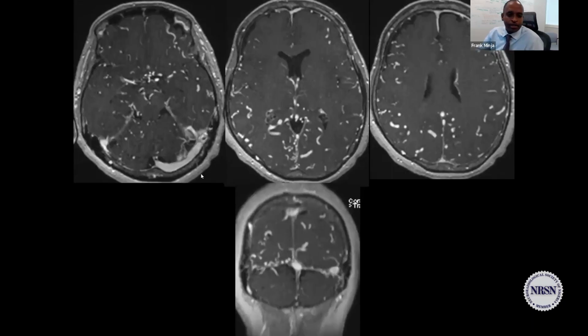I love this case because the first question is, are you looking at arteries or veins? So let's play a game here. Who votes for arteries? Who votes for veins? We've got a few more minutes here. All right, guys, let's play along. We're almost to the end. What are you looking at? Arteries, veins, arteries, veins. All right, 50-50, guys. We can play this, we can play bet. Let's get about 20 people.